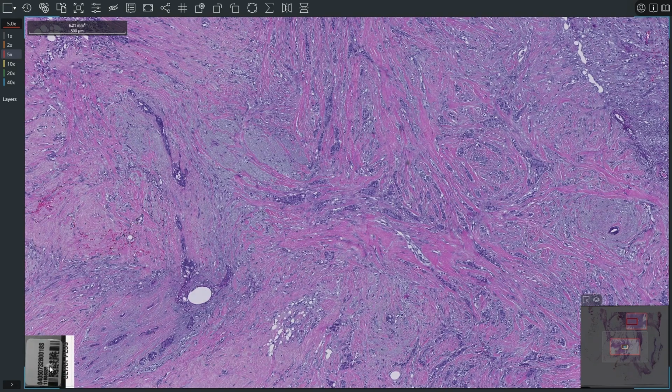These settings are saved at the user level and will be applied whenever a digital pathology case is opened by the user. To toggle the visibility of overlay elements, including the macros, click the Hide Show Labels button on the toolbar.